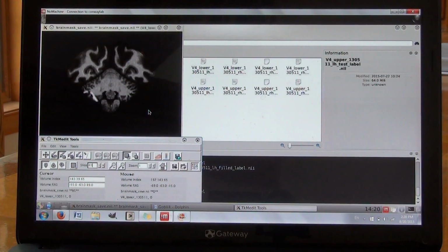Okay, this is the picture of Job's brain that we obtained from the MRI scan. And on here, I have uploaded the green line, which we created from the fMRI scan data, which you can see in the previous video. And this green line outlines where V4 is.